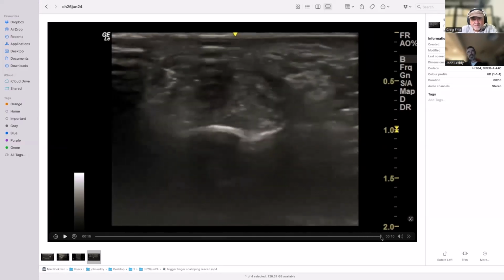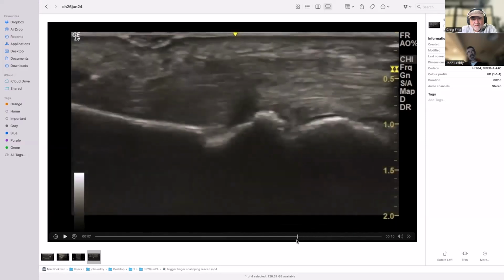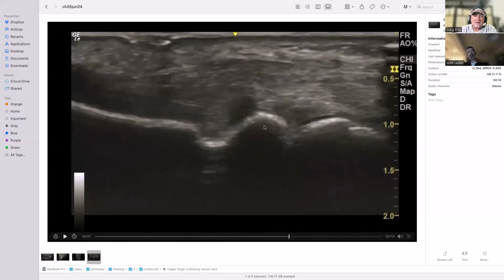Yeah, a nodule in the profundus that is causing scalloping of the proximal phalanx. Scalloping is a periosteal term. I think so. I'm just calling it that where it's taken... and I sent this for MRI because I just thought, why is this thing causing that change? But apparently it's just eaten away at the bones.